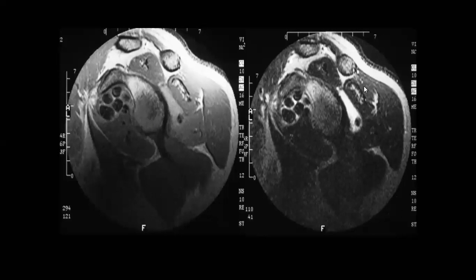Sometimes in the shoulder, if you are not used to it, the orientation can be a bit difficult. So with these loose bodies, which have dark signals, you are going to think that it is synovial, right? I see that you mentioned it. So what would you like to see? X-ray? Yeah, I'd like to see the X-ray.